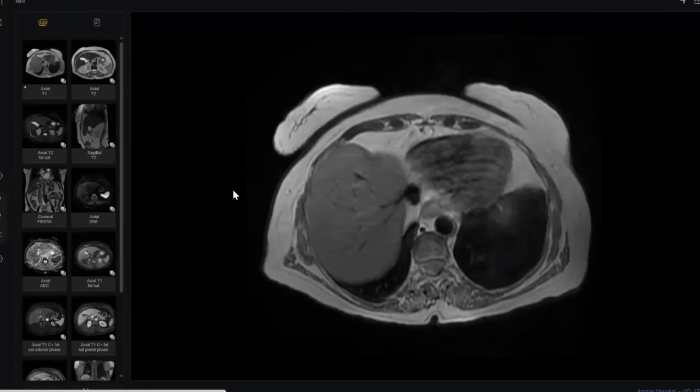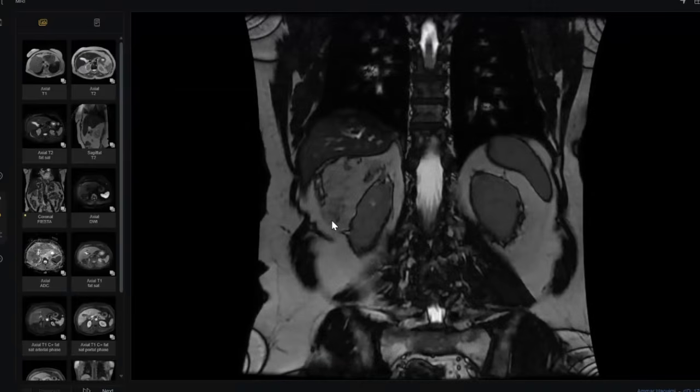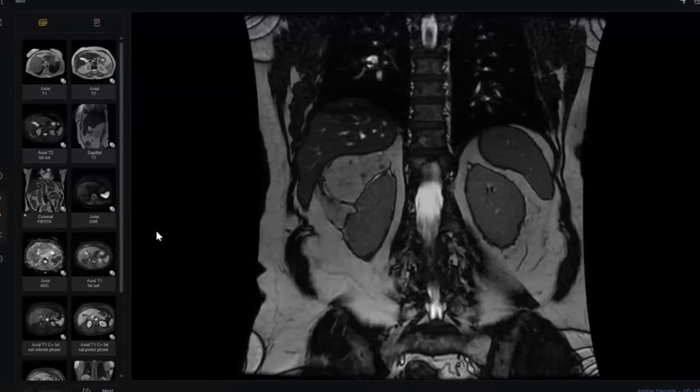Okay. Thank you so much, doctor. We should refer the patient to a urologist because we are worried about rupture because this lesion is larger than 5 cm. It is very large. I think it is more than 10 cm. I think the measurement is not here. So there are three evidences this is not a liposarcoma.